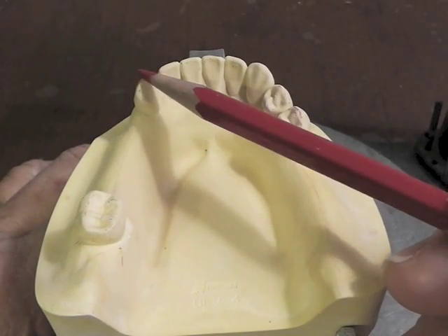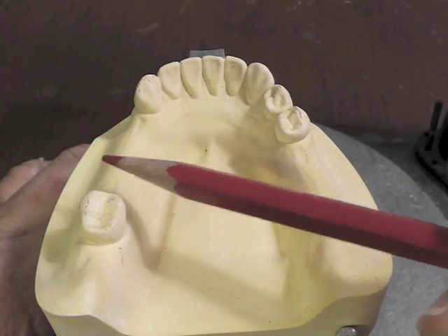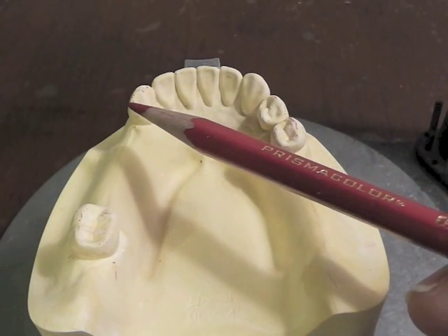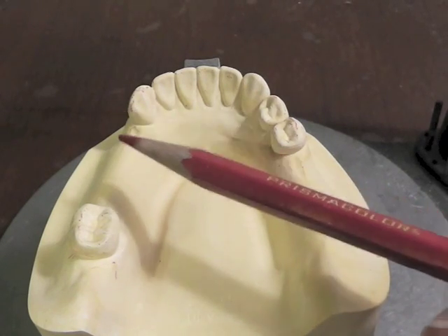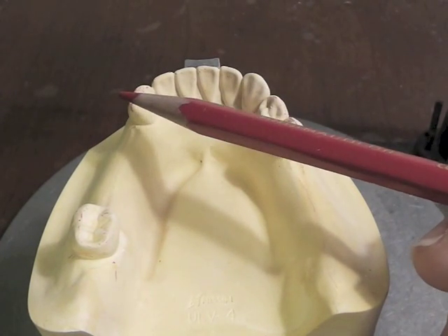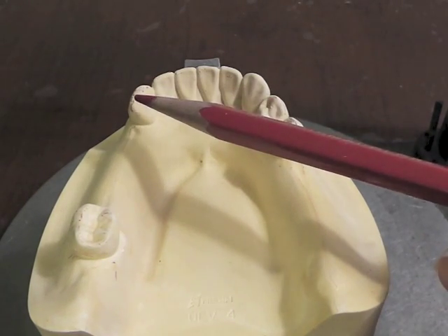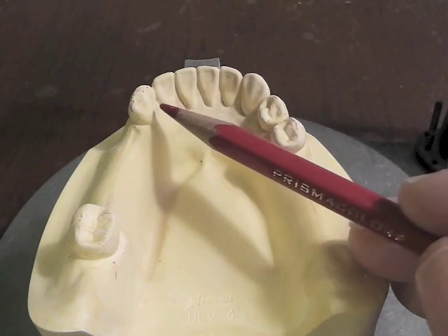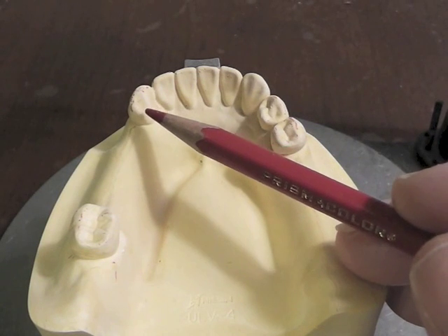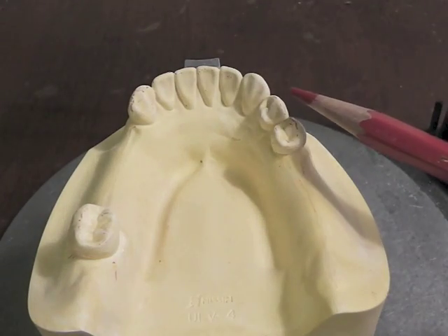We're going to have a rest on our canine and a rest on this abutment tooth. We'd like to have a mesial rest next to the edentulous area. We'd like to have a rest on this tooth. On the canine, we can put a disto-incisal angle rest if we want something that is very dependable, and it would be unfortunately a little unesthetic compared to our other option. And our other option is that we can prepare an acid etch composite cingulum rest on this tooth on the lingual surface if this patient is very aesthetic conscious.